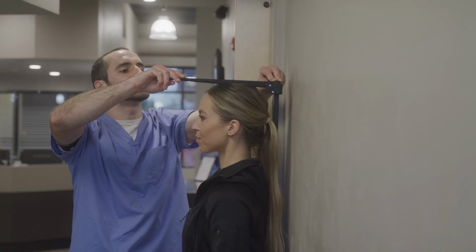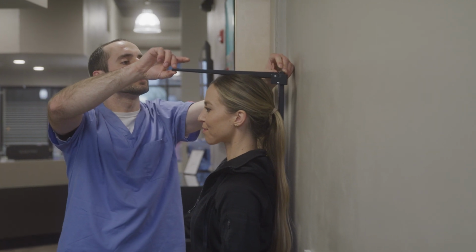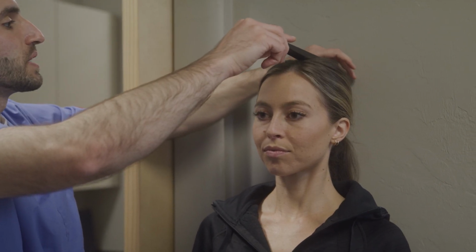A seated X-ray, as we sit somebody, they tend to compress their lumbar spine a little bit more, but it tends to take the pelvic alignment or leg length out of the equation. So we can see what changes from seated to standing to help us determine whether there's a pelvic or leg length involvement. Also, with X-rays, we can look at growth plates. So if the patient is still growing and developing, we can see if their growth plates are open, which can help us determine whether we believe the case is going to have a chance to progress.